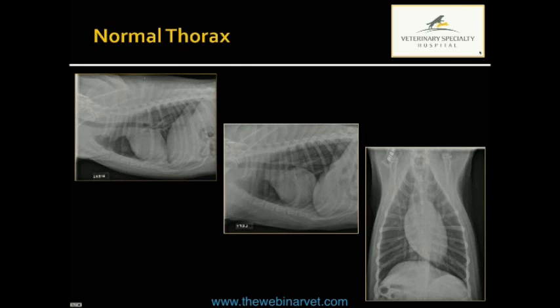But certainly you want to make sure your exposure is appropriate, that you've included everything anatomically that you need. So definitely you want to have the thoracic inlet, a little bit cranial to it would be ideal. So at the very minimum here, but we'd like to be a little bit more cranial. And then caudally, if you've included the entirety of the liver, you probably have the caudal extent of the lung field. Some people will use this caudodorsal margin. You just have to be a little bit cautious because the lung field can extend quite a bit caudal. So just pay attention to the pulmonary vasculature, and that's going to tell you really where the limit of the caudal lung field is.